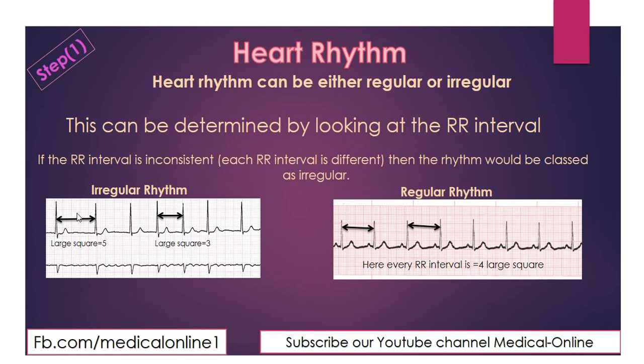Here we have one strip of irregular rhythm. I have already calculated that this RR interval is 5 large squares. You will have to look at your ECG strip. In the previous lecture I told you that the RR interval is between the apex of two R waves, so 1, 2, 3, 4 and 5. Here it is 5 large squares, and in the same strip here it is 3 large squares, so the RR interval is inconsistent. If it is inconsistent, it will be classed as irregular rhythm.